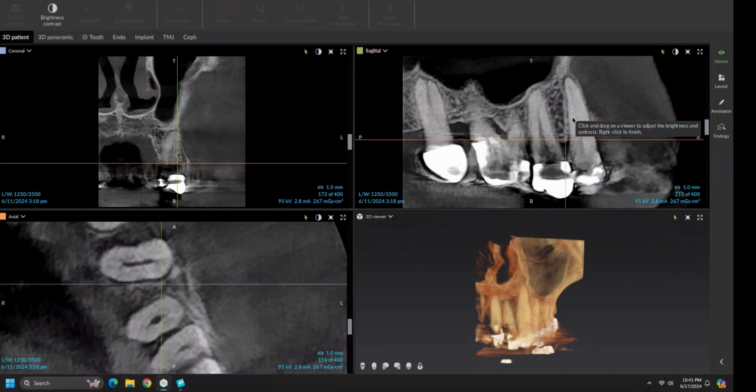So the CAT scan is helpful because it gives us confirmation on the diagnosis, but it really gives us an entire additional layer of information to help us treatment plan the case moving forward. First and foremost, when I see periapical radiolucencies on a CAT scan, very similar to a two-dimensional PA, I'm going to ask the question: is this widening of the PDL, or is it a periapical abscess, or periapical radiolucency suggestive of a necrotic canal?